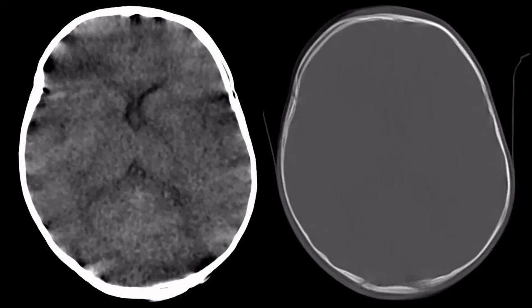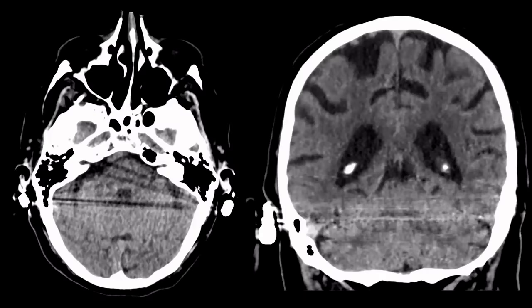We see here that the brain looks very blurry and also the skull. Is this a fracture over here or not? Well, very difficult to tell what happened here. The patient moved during the scan, and motion artifacts are a very frequent cause of artifacts during CT, and of course, they make interpretation difficult. The main thing is, don't call this a fracture, but on the other side, it's also difficult to rule out a fracture with certainty in a situation like this. The images are very blurry and very unsharp.